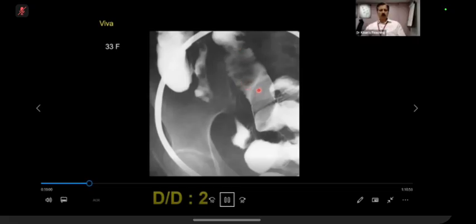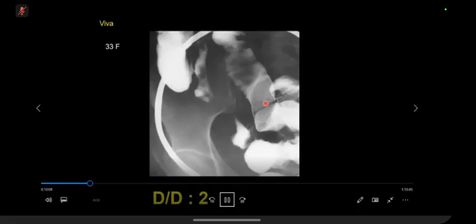Could be in the transverse colon, yeah. No, like this just is above it? Another loop of small bowel. Okay, okay. So, all right. So if that is a loop of small bowel, still I can see some narrowing and stricturing in that part as well. So if that's a stricture as well, that would represent a skip lesion.